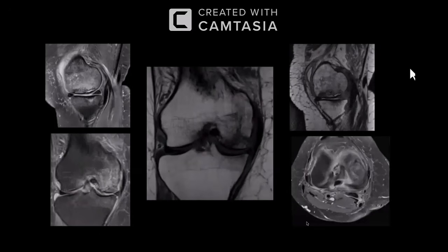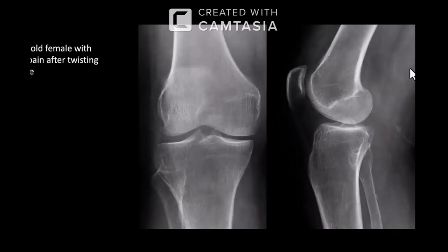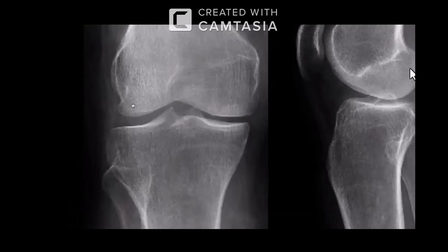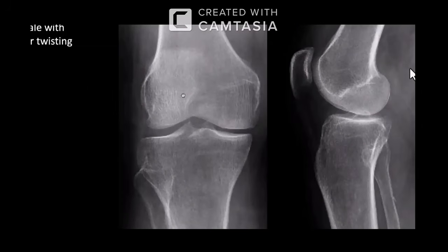Okay. So, like I said, you need to have a strong suspicion, and again, you have to go through those checklists: look at the condyles, both the medial and lateral condyle, the tibial plateau very carefully, the intercondylar notch, look at the patella, and see if there are any abnormal lucencies or any lytic lesions in the patellar surfaces.